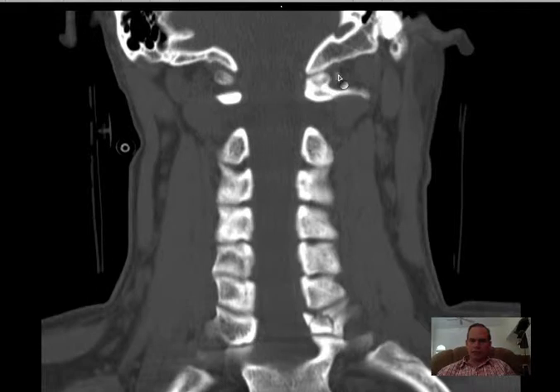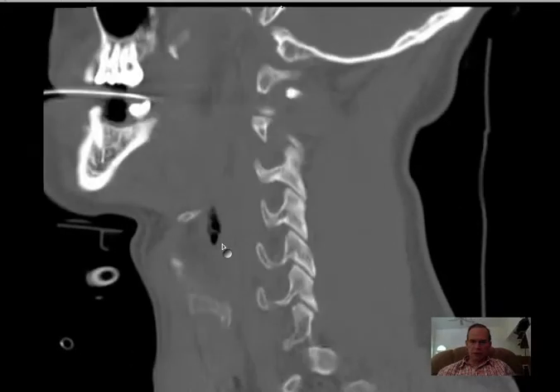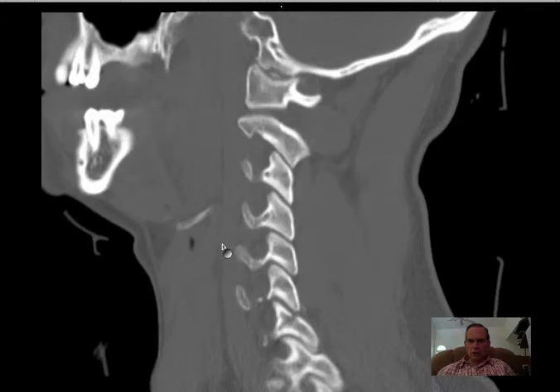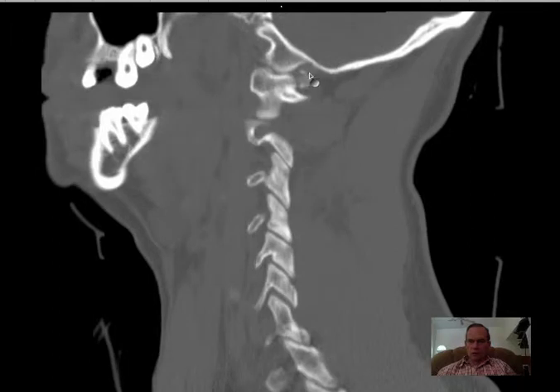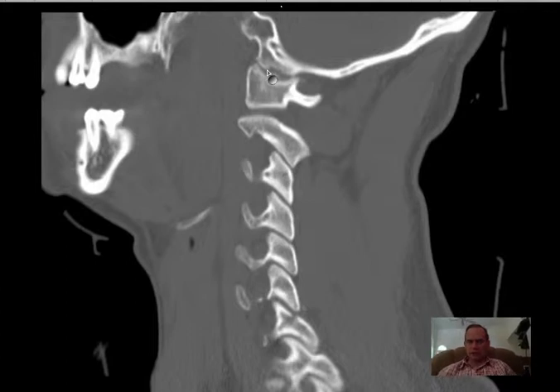And you see a little fracture off C1 as well, and it's bigger than it appears on that coronal image because it wraps around a little bit. I think we could see that and appreciate it more clearly here. Here you can see that it's larger than it appeared on the coronal image. So you have a C1 chip fracture and you have a fracture of the occipital condyle, all consistent with axial loading, probably with a tilt of the head.